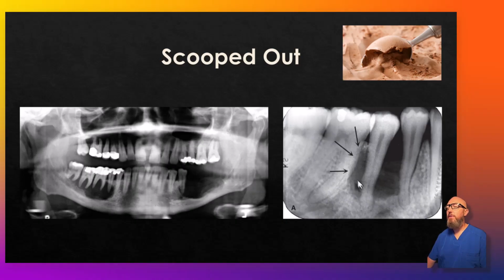So how is this different from a periodontal lesion? Periodontal lesion usually arises from the top, and sometimes you have an angulated defect against the root of a tooth. Rare is it going to kind of scoop under a bone. Sometimes periodontal/endodontic lesions can do that, but then you'd expect it more at the apex. And so that's a classic appearance for Langerhans cell histiocytosis.